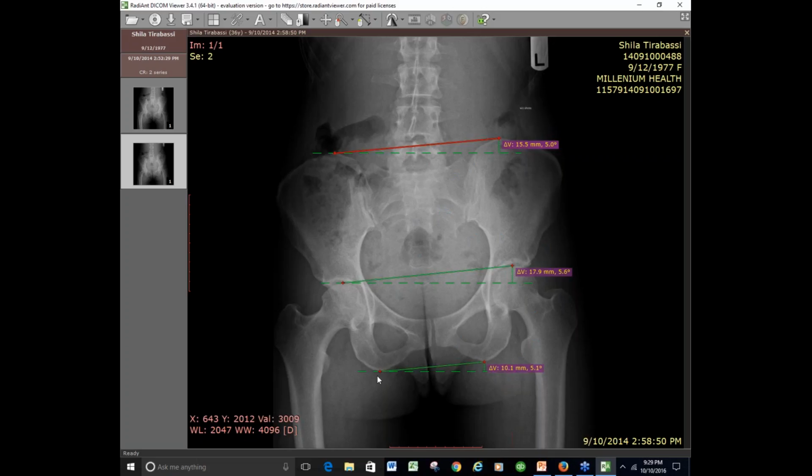This line is not twice as long as this line because she's a woman. Her ischial tuberosities are a little further apart, and the crest of her ilium isn't so discrepant from her ischial tuberosities. So it's less of an issue, but there still is one. It's calculating at 5 when it really is none.